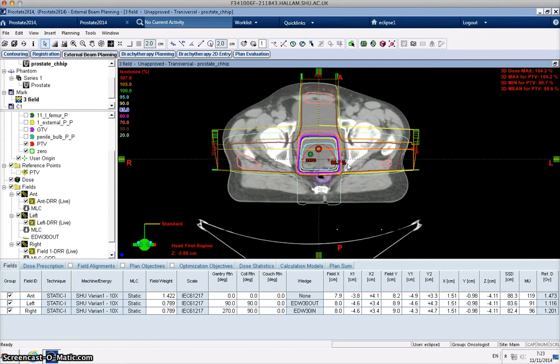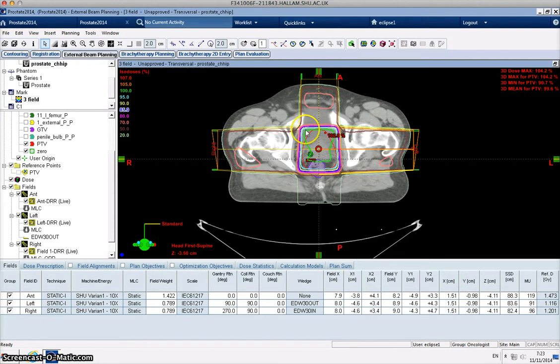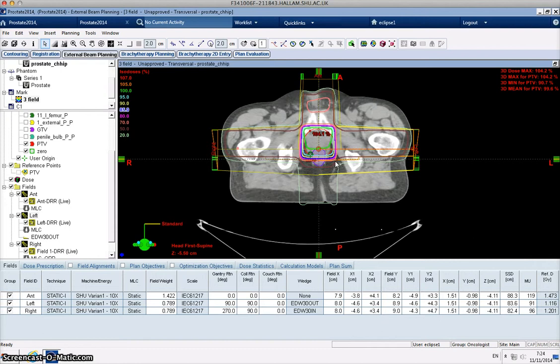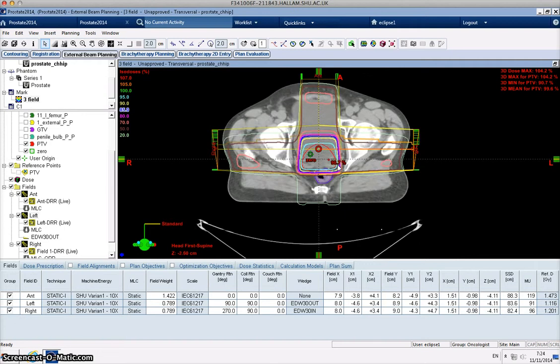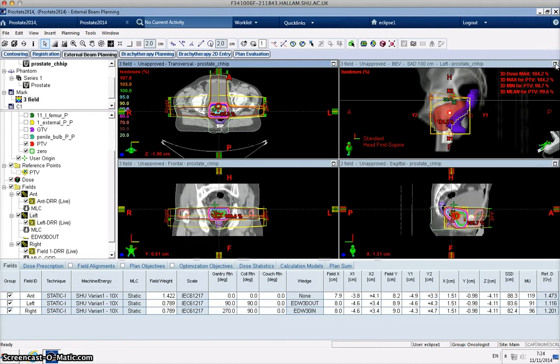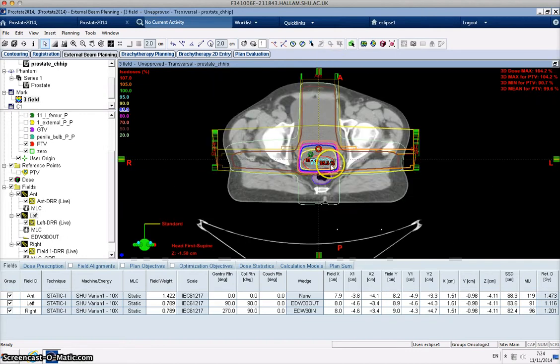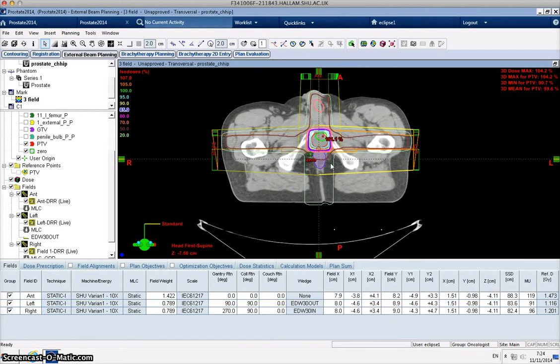So we're looking for a general kind of dose distribution in terms of our 95 to 107. We can see here that in lots of places this conforms quite nicely. Again, we're limited to this box shape, but as we get to this point here, we can see on the superior slices up here, we're underdosing the PTV, and if we look inferiorly, then again we're a little bit tight on there.